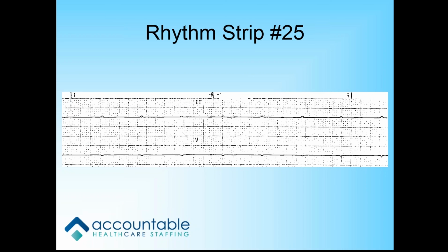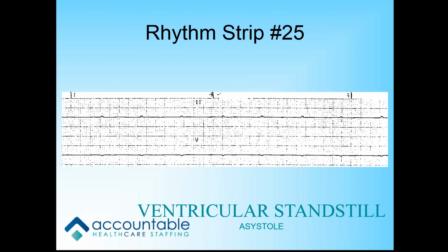It looks like asystole. Very good. Ventricular standstill or asystole. If you stick with asystole on all of these, whether it's agonal or ventricular standstill, they all mean asystole. So what are you going to do for this patient? CPR, epi. Yep. Pace. Okay, very good. Thank you. Next.